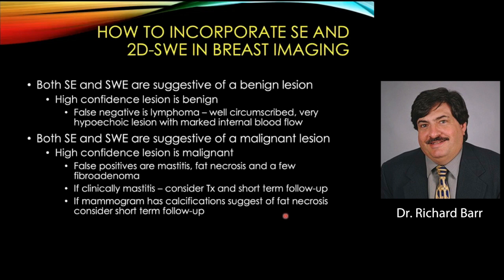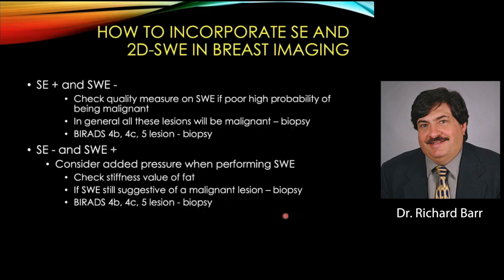We don't see it well on B mode. So the lesions appear to be larger on strain and they're much stiffer on Shearwave. So if we think that the patient has mastitis, instead of biopsying, we would treat and do a short-term interval follow-up. If the mammogram is calcification suggestive of fat necrosis, again, we would consider a short-term follow-up. If strain is positive and Shearwave is negative, check the quality of the measurement of the Shearwave. If the quality is poor, that's probably going to be a malignant lesion. And in general, all these lesions are going to be malignant, and we biopsy them. And if they're BI-RADS 4B, 4C, or 5, we're certainly going to biopsy them.